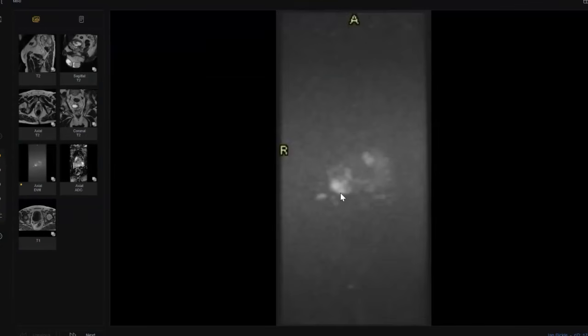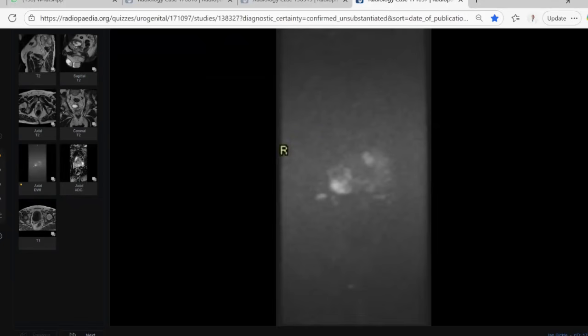Look here, very obvious, very obvious. This one, and I think I have a doubt about this one. Okay, my colleague, the most important here to know, one second, I will show you a very important image now about the prostate.